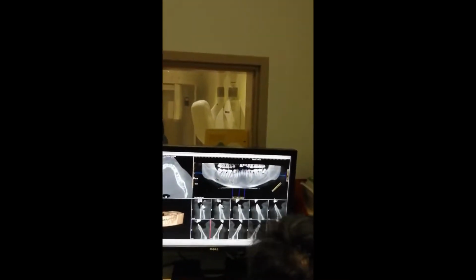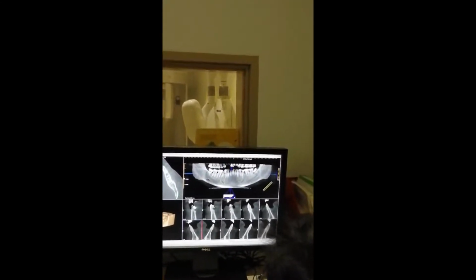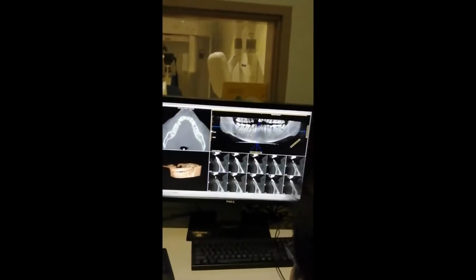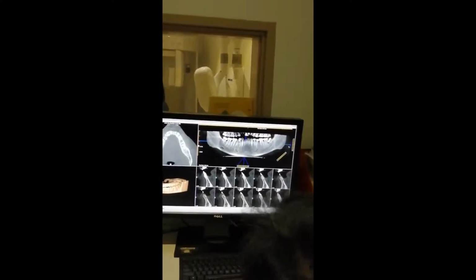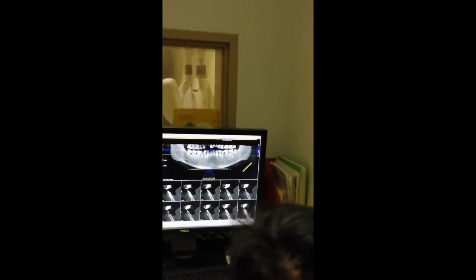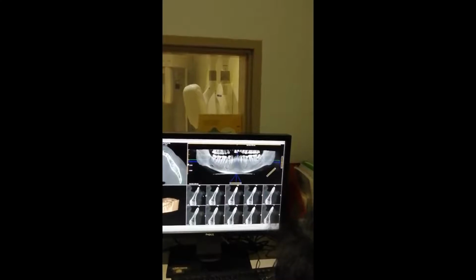So always what I do, I reduce it. I don't want 3.5. I want the minimum thickness this machine gives, so we will get that. More details can be seen in each level. So the least would be 0.25. Fine. This is a vertical one, and this is a horizontal one. Now, below we are seeing so many displays here.